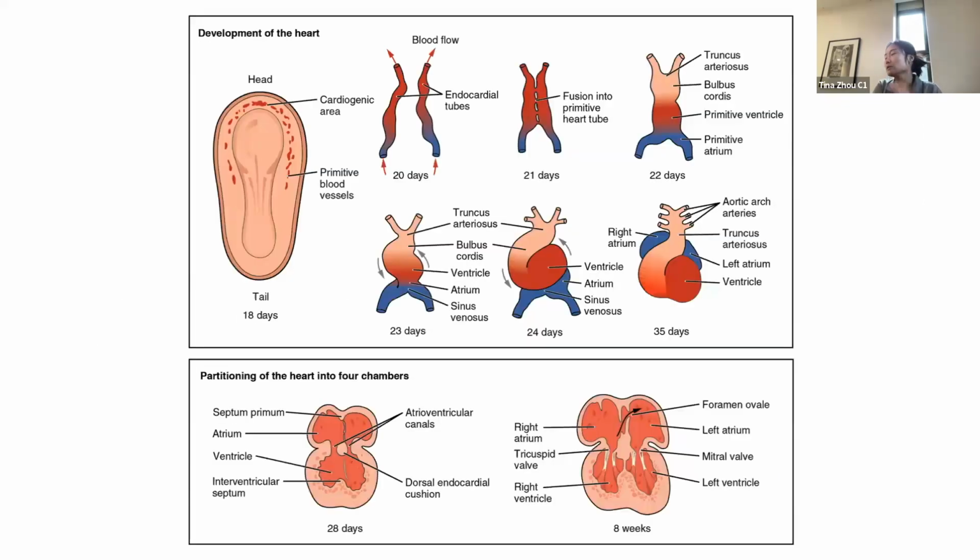So it looks like the right atrium has a lot of embryologic remnants, and I think it's worth digging into why that is the case, which explains why we're seeing them and where we're seeing them. That also helps us differentiate them from pathologic findings. So, my very brief embryological explanation.